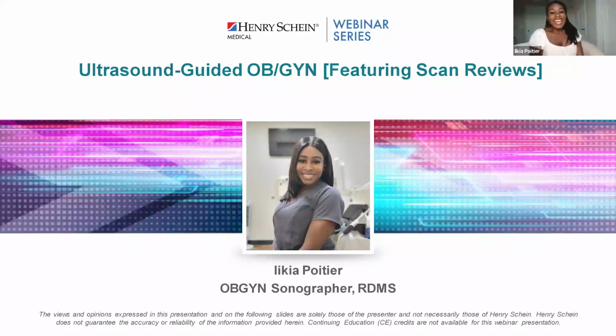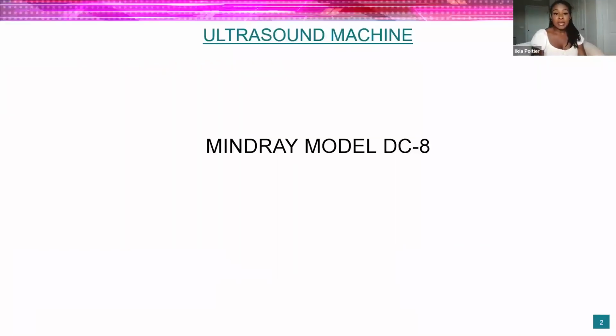Okay, awesome. Good evening, everyone. Just like Shirley said, my name's Iikia, and I do all things OBGYN ultrasound. It's my passion, and I love it. So we're just going to go ahead and get started. I'm going to let you know that I'm using the MindRay DC8 ultrasound machine model, so the images and videos you see today are coming from that particular model.